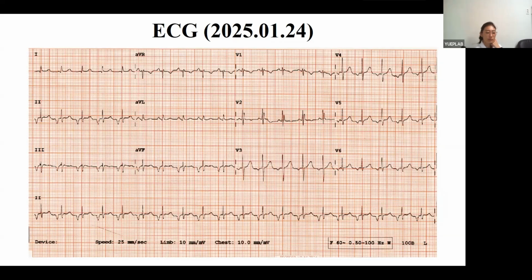There's no significant ST elevation or Q wave in this ECG. I agree with you. You see the narrow QRS tachycardia with T wave inversion. I also think it is an AT with an AV origin, or near that origin. Okay.